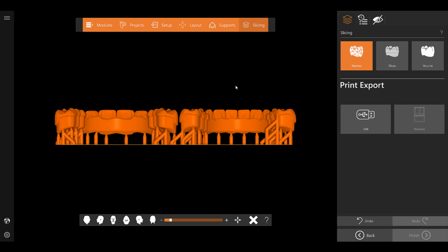Following this, a fully automated process takes over and handles the nesting, orientation, and generation of support structures. The final setup for slicing is presented to the user, who can review the result before uploading the sliced data to the printer.